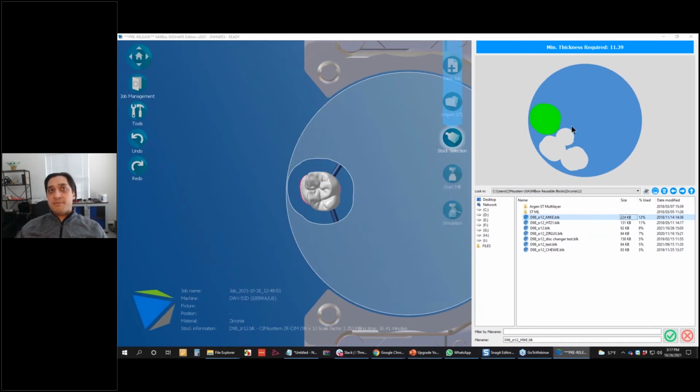We do that specifically because if you are constantly selecting new disks and importing new disks of the same thicknesses into your library, you're growing your partially used stock library, but you're not effectively using the disks that you've used before. So you want to use the disks that have been most used in the past, so you can get those out of your library and move on to those that have more and more space as you go along, and of course to the point where you need to add new disks into that library.